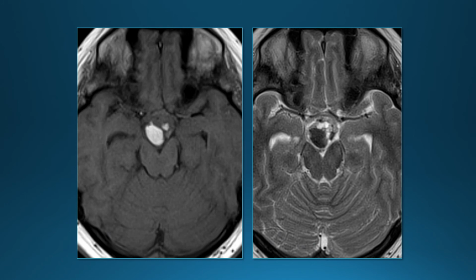The cystic components of the craniopharyngiomas can have various types of material in them. At surgery, it's often a thick type of material. On T1 weighted images, the cysts are often T1 bright and T2 dark, but the material can vary. But if you see this T1 bright, T2 dark material, that's fairly common with a craniopharyngioma.